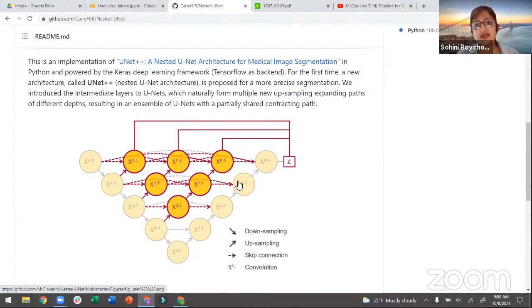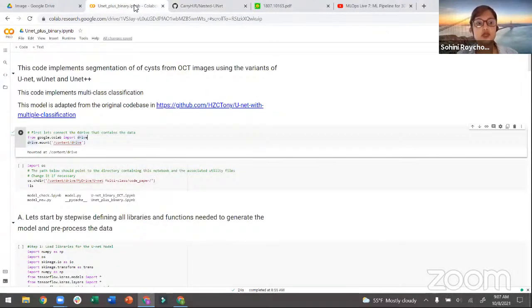So in some cases, it might even happen that maybe the third level sampling is good enough, in which case you should ideally have reduced the Unet depth and made it three levels only. But yeah, that's for later. What I wanted to show you is how we actually go through all of these different depths and see how the performance is changing. So that's just the background. This is what we are using. And now we are going to get into our code.